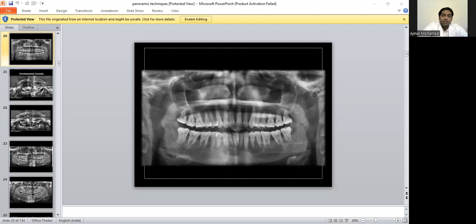On investigation, we found that there is a bifid condyle present on the right side and the left side of this patient. This anatomical variation on both sides might be the reason for the squeaking sound. There is no actual treatment for this other than surgical remodeling of the TMJ. We have convinced the patient regarding the anatomical variation and the reason which causes the squeaking sound for him.